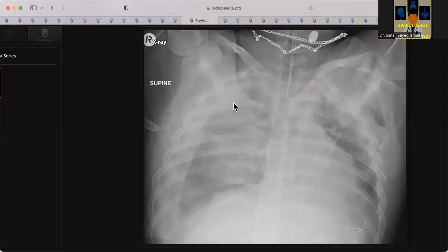What about this lung here? Can you see anything here? There is some diffuse opacification, which could be due to intraalveolar hemorrhage in the context of trauma. I would like to confirm these findings with a CT scan of the chest, preferably with IV contrast injection.